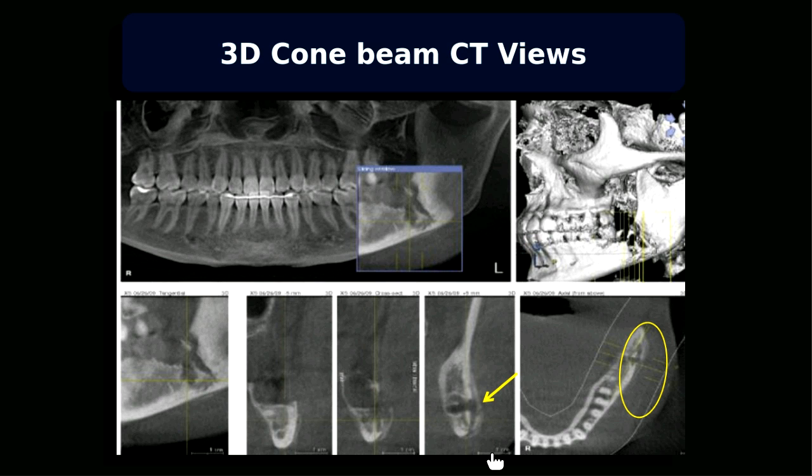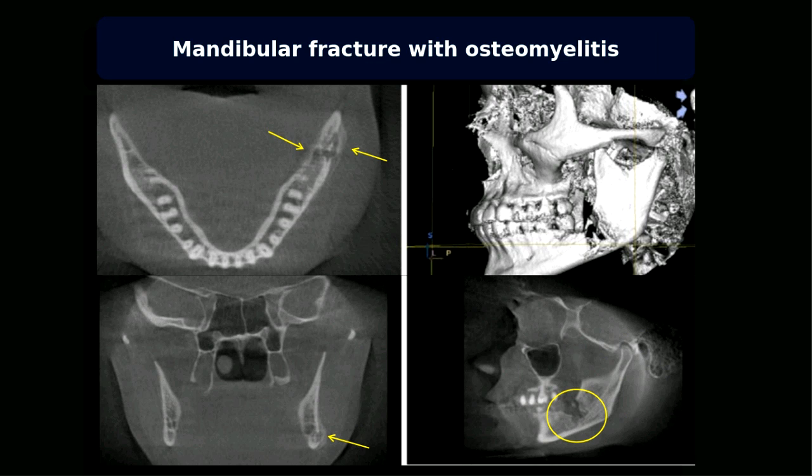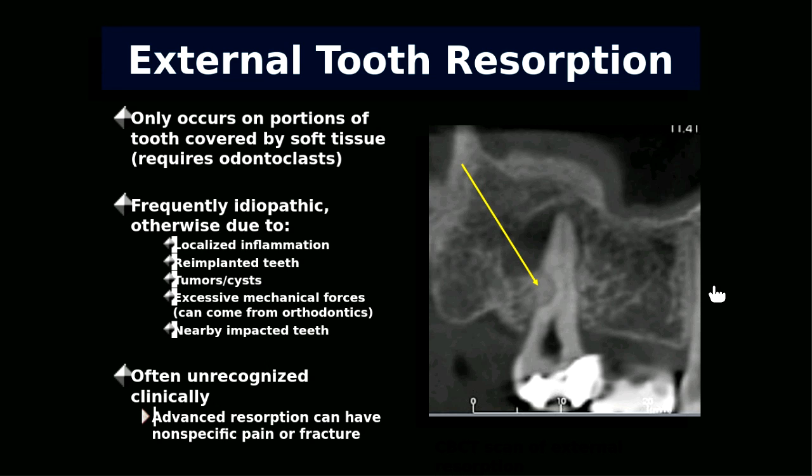Whenever you have new bone formation in that area, it is called chronic osteomyelitis. You can see on the axial view, you can see a lot of bone there. So at the time of surgery, it was broken and they missed it, and the patient has to pay a very heavy price for that. So you can see there's an extra layer of bone. They call it periosteal reaction in that area. So whenever you see something like that, that means there's a chronic inflammation going on. So there's a fracture after that because of the inflammation, a pathological fracture too.